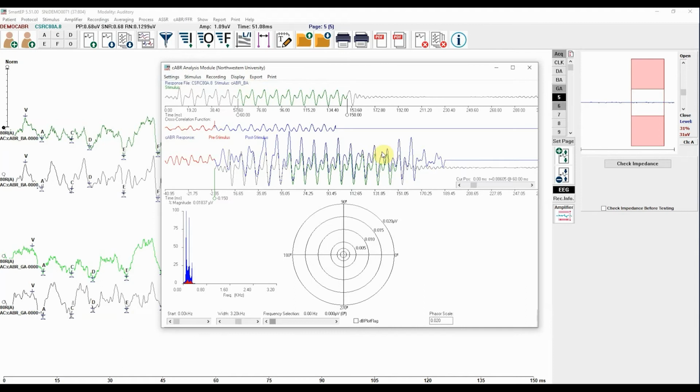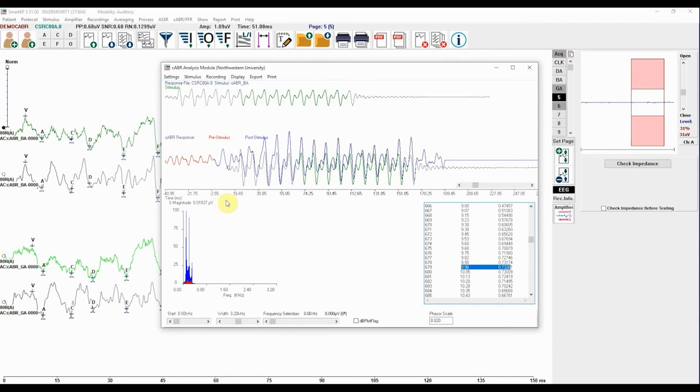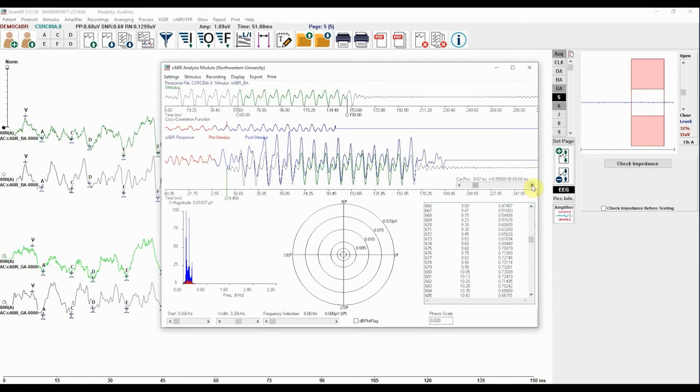Users can examine the cross-correlation table and look for data points of high correlation. To activate the table, click on the display and select Cross-Correlation Table. Users can also align the stimulus with the response to obtain the highest R value. Note that the cross-correlation values are higher as the stimulus analysis region becomes narrower to several periods of the vowel portion of these stimuli. The absolute number of where this occurs is going to vary with different stimuli and potentially with different subjects, such as if there is a dysfunction-based latency delay in a particular subject.